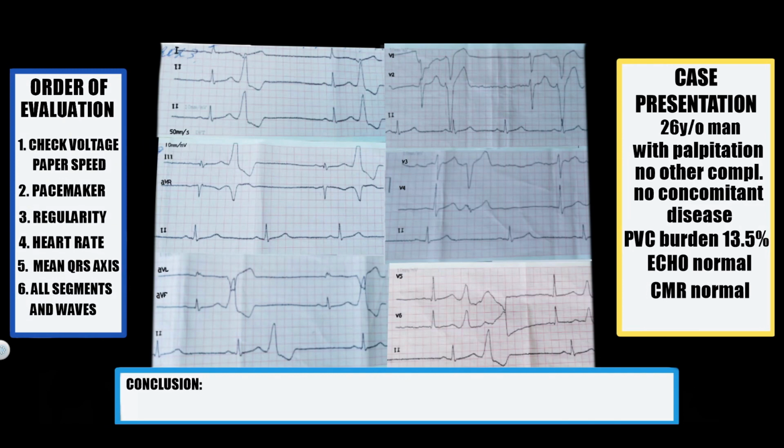Both echo and CMR without any changes. I will have a question about this case in the end of this video, so keep watching until the end. We will examine ECG by the order in the left.